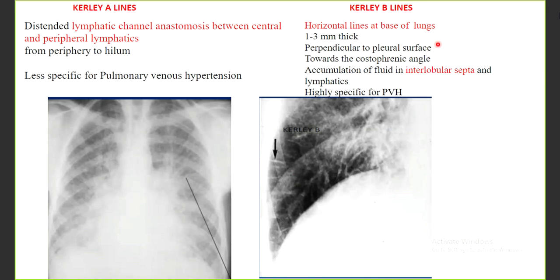It's mostly lymphatic. It is very important that as a radiologist, or when you see the X-ray, as a physician, you identify these Kerley lines because they invariably mean that the patient has significant pulmonary venous hypertension and the LA pressure corresponds to more than 20.